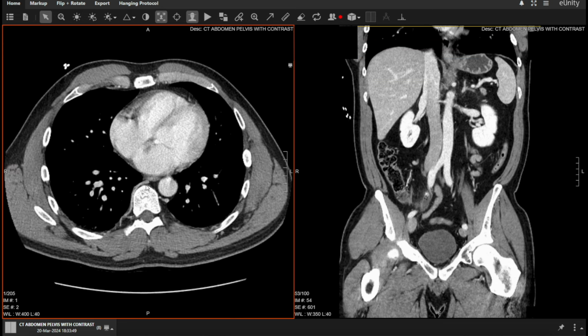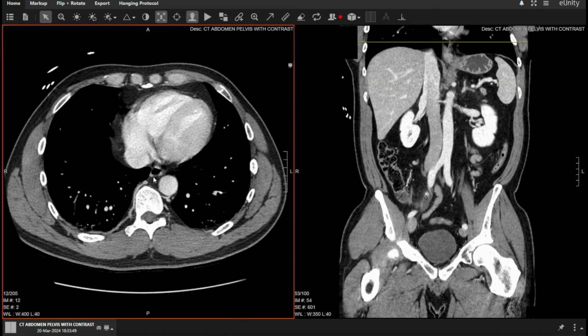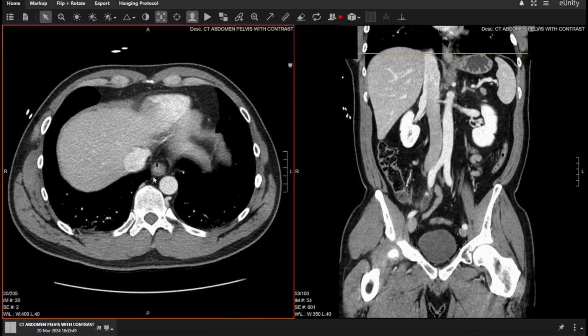All right, so back up to the top. We have our chest, our back, left lung, heart, right ventricle, always against the sternum, aorta, azygos, and esophagus. So we're going to move down now into the abdomen.